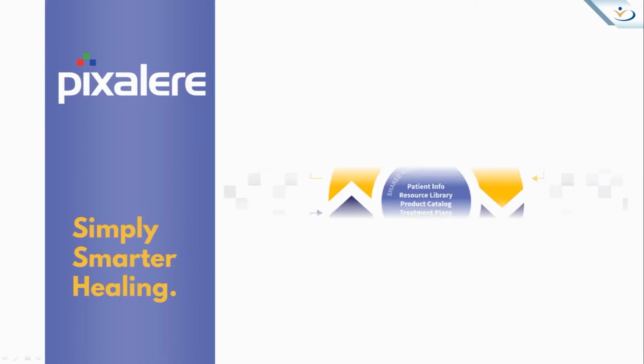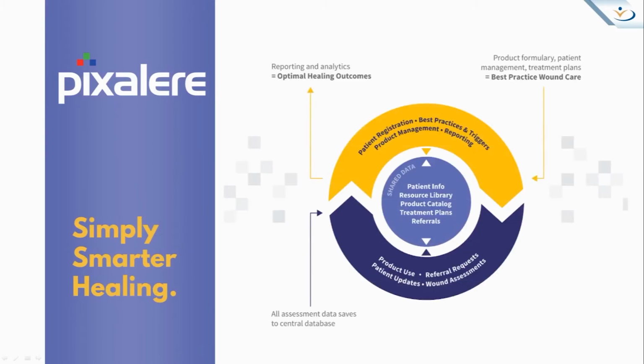Documenting in Pixalere provides a good overall understanding of the progress of the wound, easy consultation with the wound care clinicians, and improved wound healing times for patients.